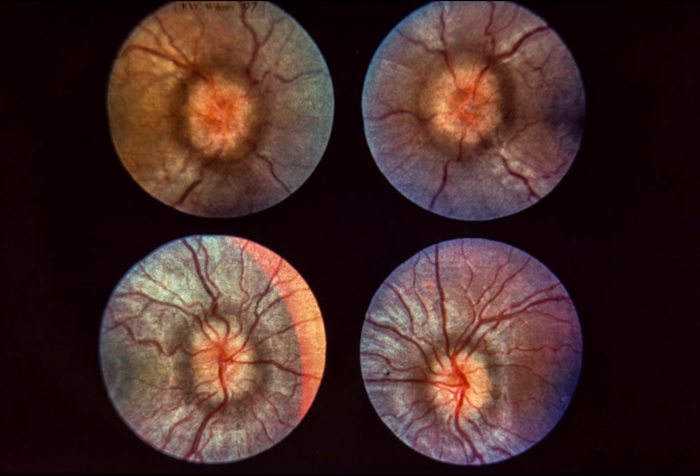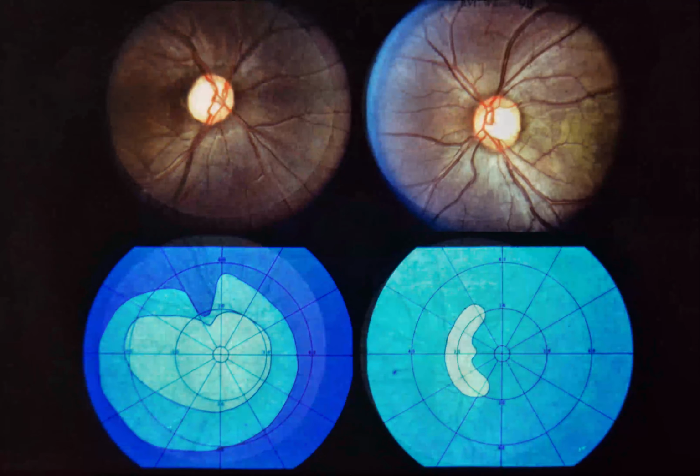The patient shown below also has elevated optic discs. However, neither disc is hyperemic, and the retinal vessels are not obscured as they traverse the discs. The peripapillary retinal nerve fiber layer is seen up to the disc margins. This patient has buried drusen of the optic disc. No further studies are indicated.